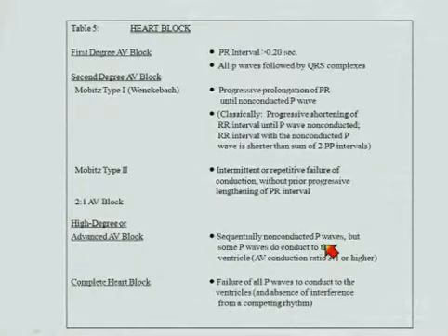All right, heart block. We don't need to dwell on this. You know it well. Just a couple of terms and a couple of points. Remember, with Wenckebach, one of the characteristics is that there is a progressive shortening of the RR interval until the P wave is non-conducted. That's important not for AV nodal Wenckebach, but for rhythms where you don't have P waves, like sinus node Mobitz 1 exit block. It's that shortening of the cycle before the pause that's very important. And the reason that it shortens is that there's progressive prolongation, but the greatest increment of that occurs in the first beat.